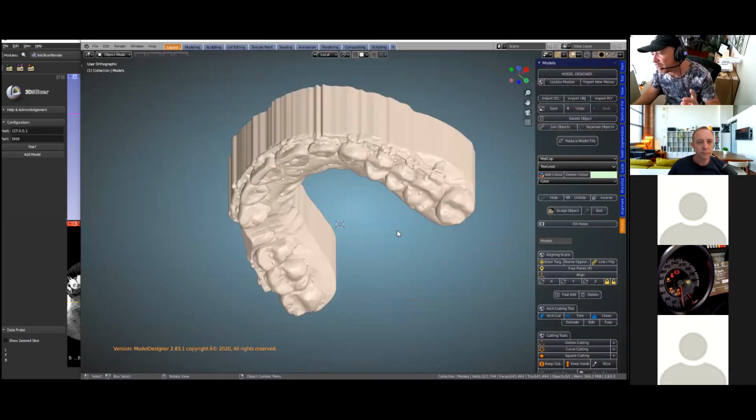Okay, before you even make a guide, you need some good models. Then the user hollowed them and had honeycomb. Now, we can't do that because if we're putting this into the DICOM to edit, you'll see all these hexagons all over the bone. And we can't do this. So we've specified in our videos, please, these models have to be solid. If you'd like to make them hollow at the end of it, for printing, that's fine. But for implant planning, it needs to be solid.